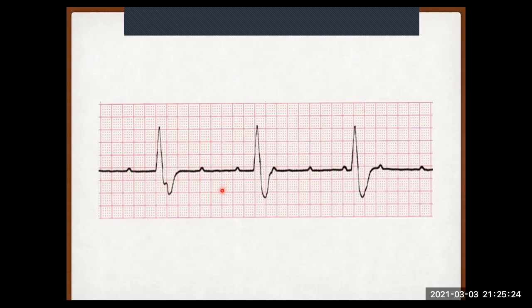And this is a type of a heart block. The reason why we say it's a heart block, because there's a blockage between the atrium and the ventricle. Now, there's 4 types, but we're not going to get into that right now. The most important thing I want you to think about, if there's no association, as you can see here, there's nothing to combine a ventricle with an atrium. The atrium is functioning completely independently, and the ventricle is functioning completely independently.